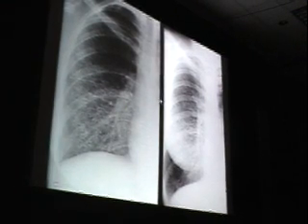The harder one and the real-life situation is this, where you have basically a young woman, diffuse interstitial lung disease, large lung volumes, no pneumothorax, no pleural effusion. Is it EG or LAM? Unfortunately, I'm forced to admit that on the plain film, you really can't tell. They both look virtually identical.